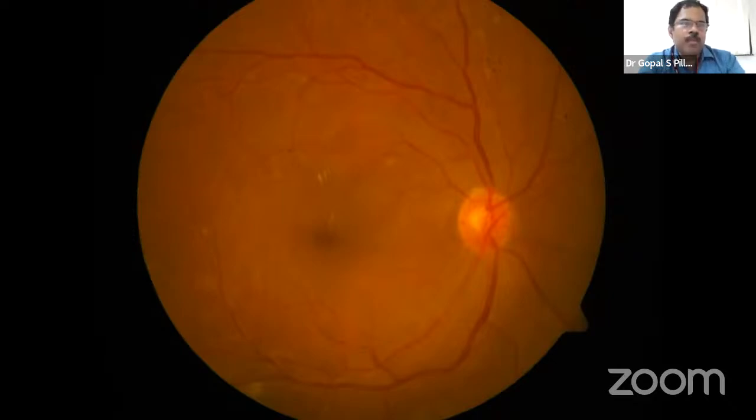Currently, if there is diabetic macular edema involving the center, the first thought process would be to inject. And yes, if a microaneurysm is there, like sir is showing in this particular picture, away from the fovea, and if it is more than 350, 400 microns away and the visual acuity is below 6/9, we may safely consider laser of that microaneurysm, which is very away from the center of the fovea, before you actually go in for an injection. It's possible. But after a laser, probably you'll have to wait for maybe a couple of months to see the results and then only decide on the further treatment.